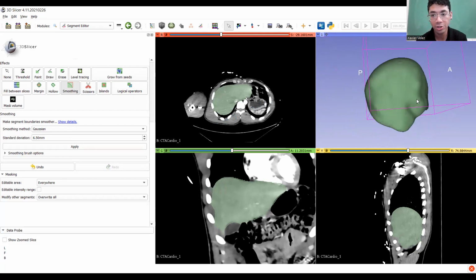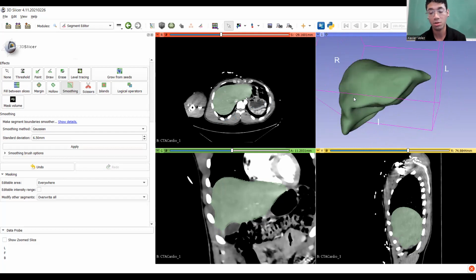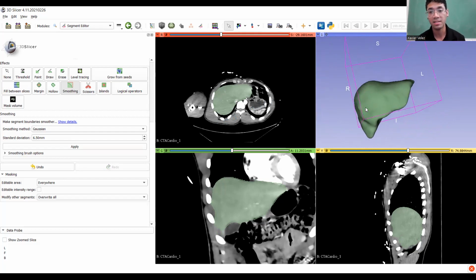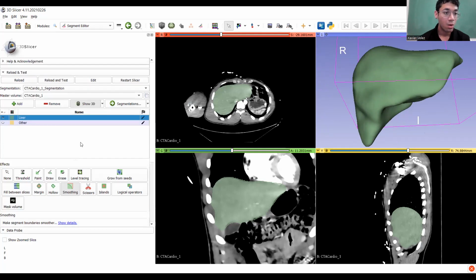There are a few imperfections, but instead of trying to smooth those away or anything like that, I think I'm actually going to just try to edit those manually. And that is going to be the next and pretty much final step that we have until we're ready to export our STL file. So from this step, we're just going to go.